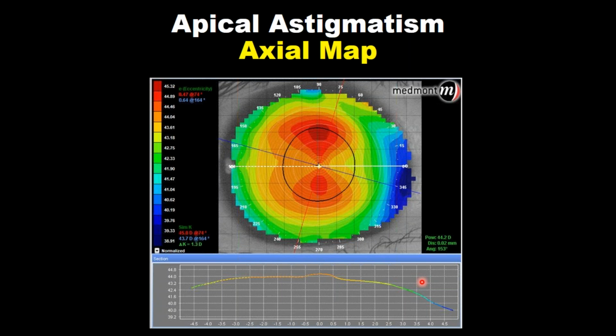So something that you might consider is understanding the eye shape beyond what's happening in the center. And one of those things that you could do is to measure sagittal depth. Instead of thinking about the flat K reading, how steep or flat the eye is, why don't we add to our construction what is the depth of the surface along the principal flat meridian, in this case 1541 microns.